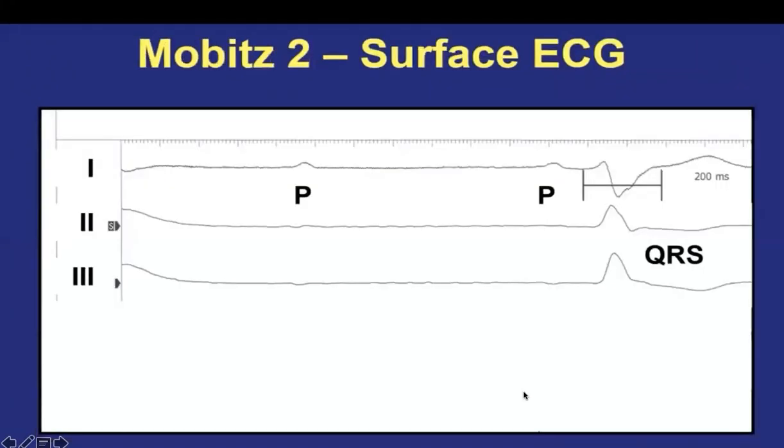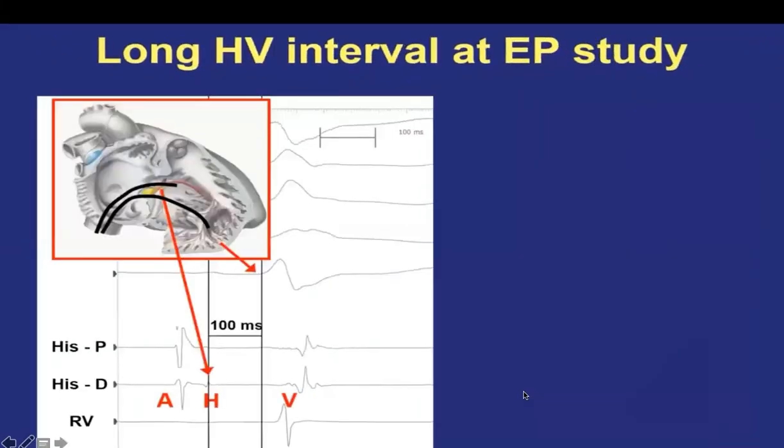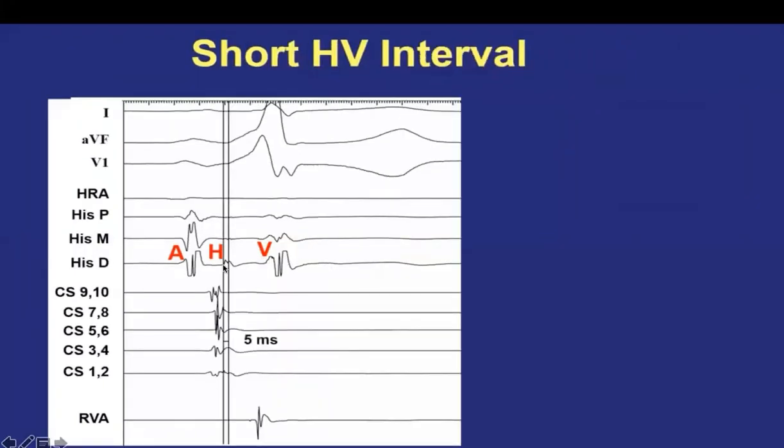Now, we talked about Mobitz type 2 and the HV duration and the effect of that. And on the opposite side, we talked about the short HV, in which there is a delta wave affecting the HV interval. That will give you a short HV, because if we say HV duration or interval, we are starting from the His activation till the first deflection of the V, the V and the QRS, not the local electrograms. So that will give us a very short interval.